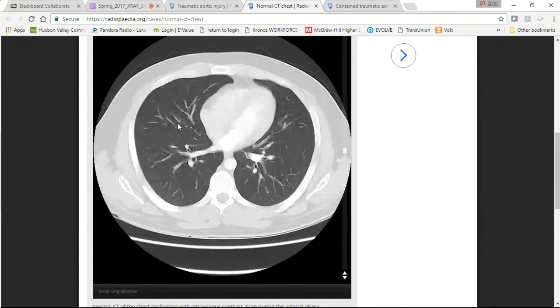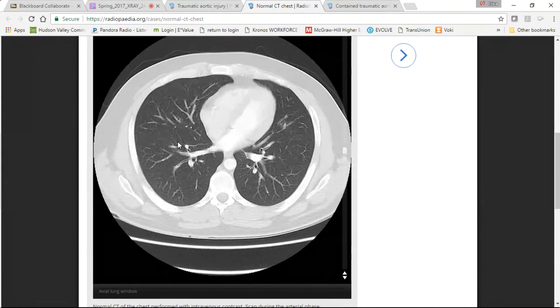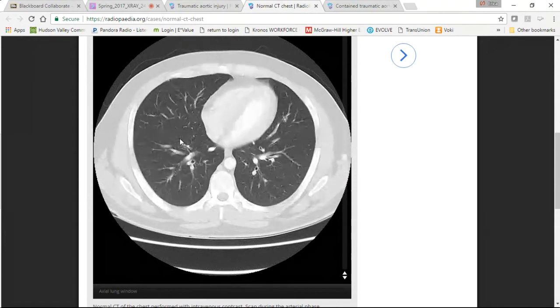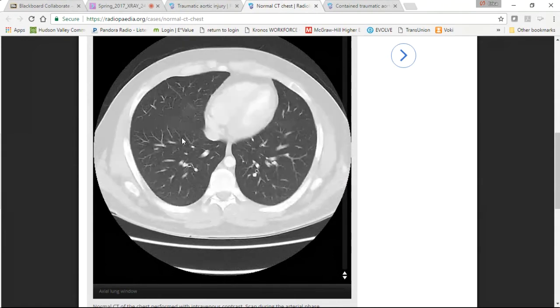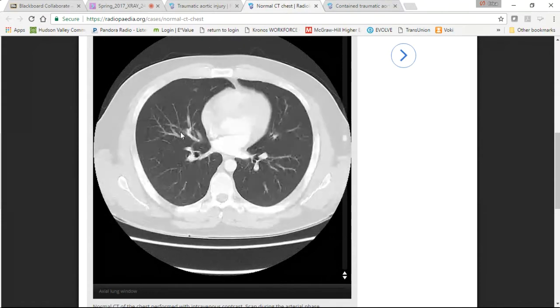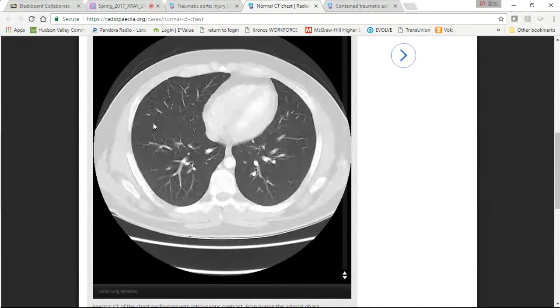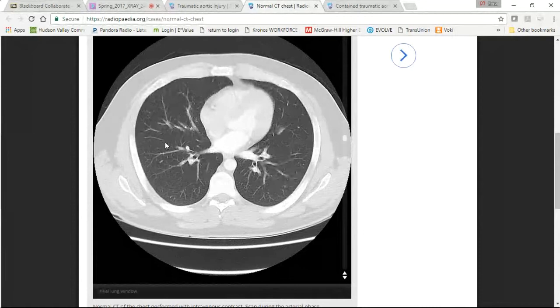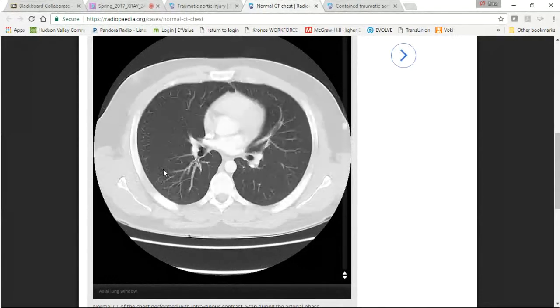What is kind of hard to see, we're kind of seeing it on this axial slice, is the fissures. So we know that the fissures are there, but we're kind of hitting them at an angle that you're not really seeing them clearly defined. So the thing that I do want you to see on the axial here is as I scroll up and down, do you see this blurred kind of line here? That's us seeing these fissures in a weird plane. See this blurred line? Okay.